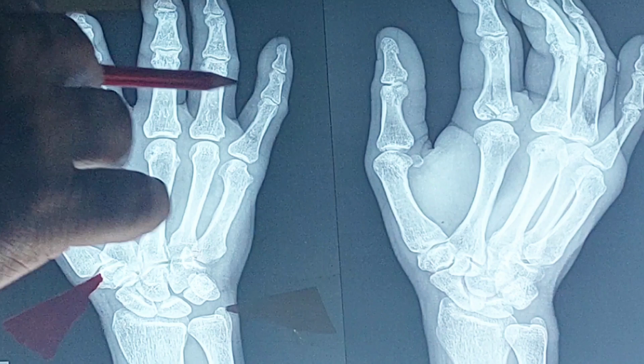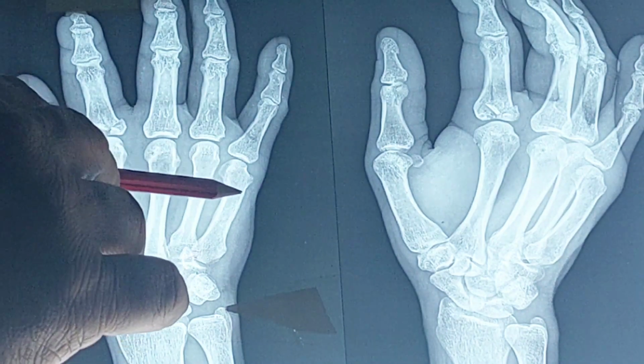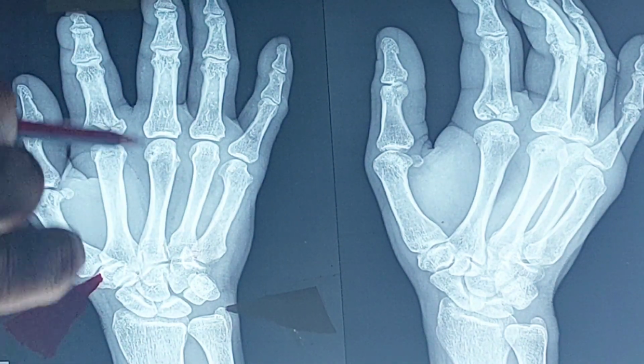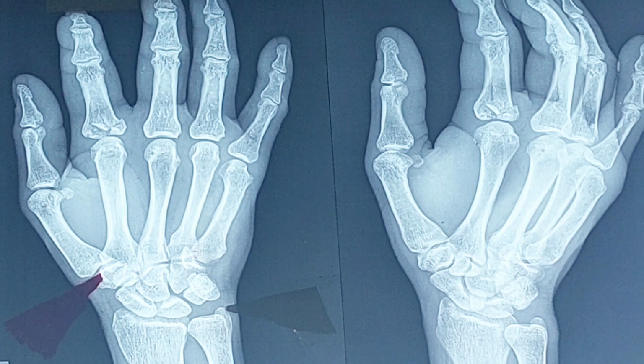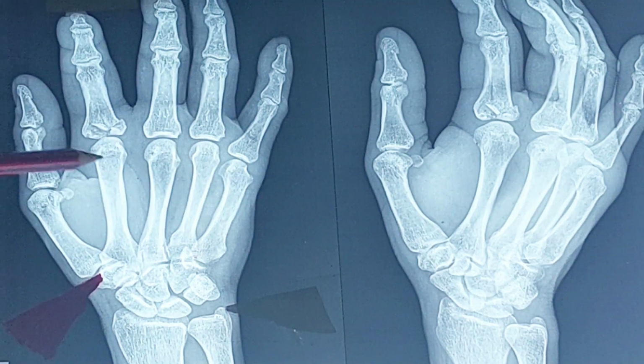All the phalanges are also examples of miniature long bone or short long bones, because all these bones have one diaphysis for the shaft and one epiphysis either at the base or at the head. But where do you get this epiphysis? At the base or at the apex? All the metacarpal bones here, except the first one, their epiphysis lies at their heads.